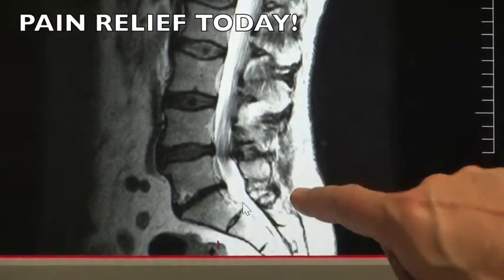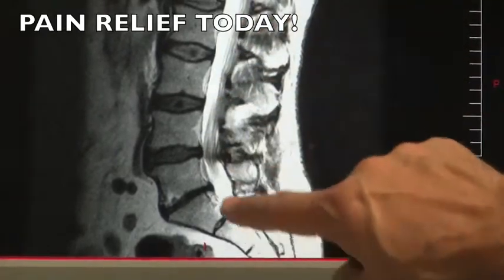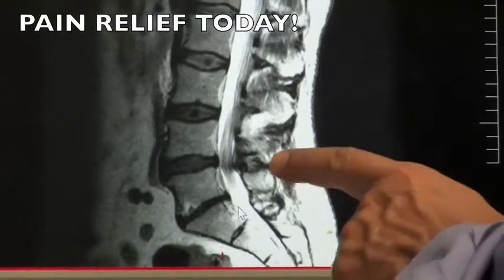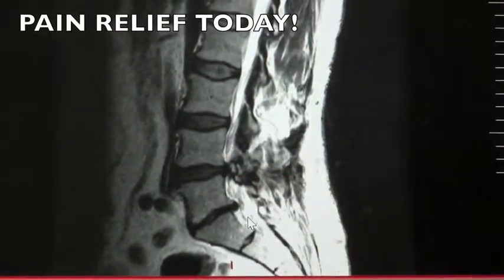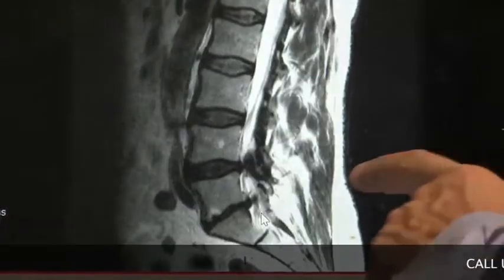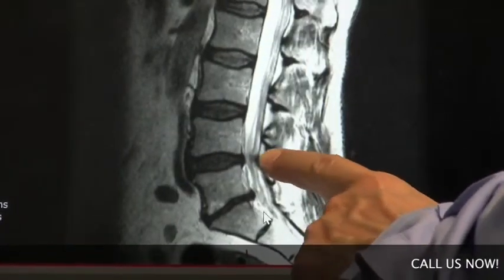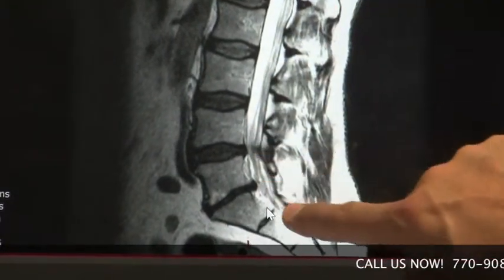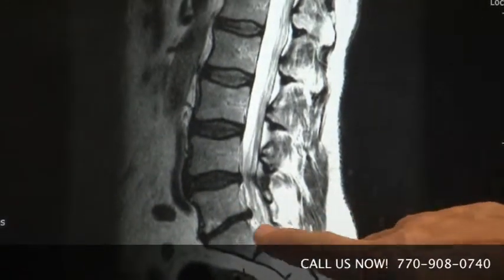This gentleman has low back pain, and it goes down both legs because it's pinching nerves as it comes down here. This disc is not as compressed, but there is a little bit of a bulge that you can appreciate in that particular slice sticking out right there. That can hit the nerves. And again, I don't mean to be redundant, but this tissue right there is ligamentous tissue that's sticking out in the canal, so it's hard for nerves to pass all the way down here to get where they need to go. So that's the source of compression.